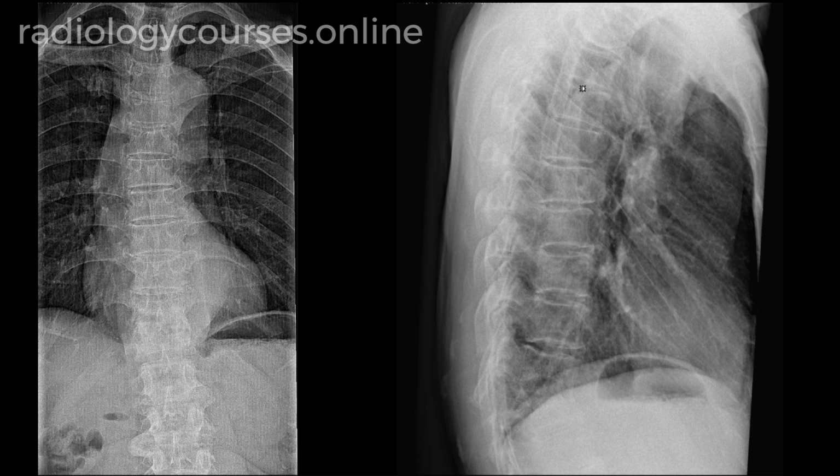The vertebral bodies appear unremarkable in the upper and mid thoracic spine, but as I come lower down, exactly where it is overlapping on the diaphragm, with change of interface between lucency to hyperdensity because of the lung and abdominal organs, we see loss of definition of the end plates here at the level of T11-12. On the AP view as well, when we look carefully along the vertebral bodies, there is destruction of the end plates at the level of T11-12.